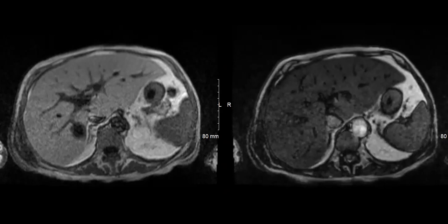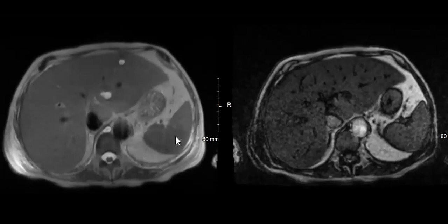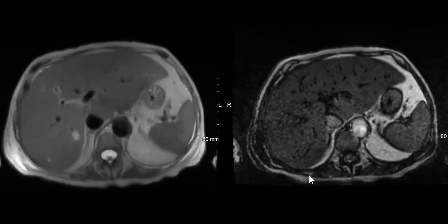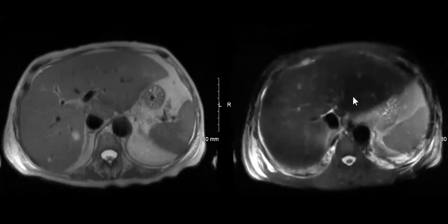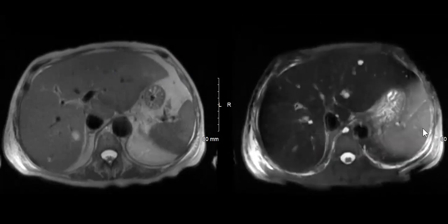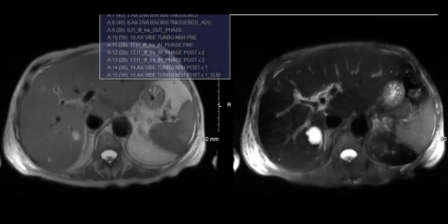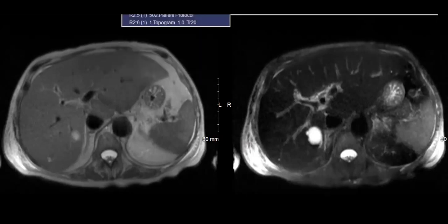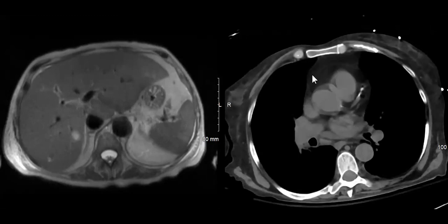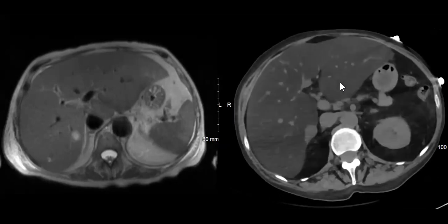That's super cool. Can you show the T2 and fat sat here? Just want to see. You can see how bright the liver is with respect to the spleen. And in terms of fat sat, again, this is a free breathing protocol. So here's the T2 with fat sat. You can see now the liver regains the normal relationship with the spleen, it was darker. And they change a lot between the T2 and the T2 fat sat. So that's your clue too. Yeah, so that's another clue. This one's 2 days prior, and you can see this is what it looks like. It's a pretty bad steatosis.